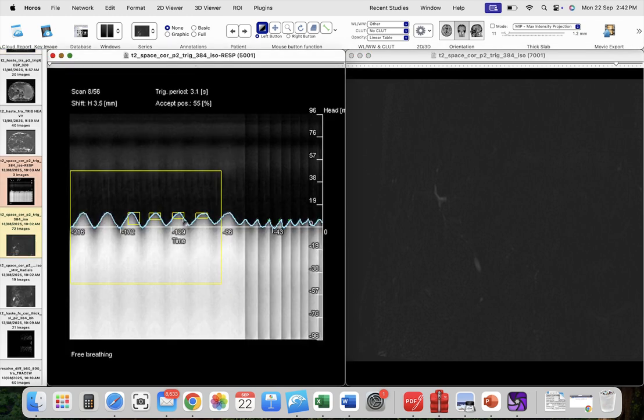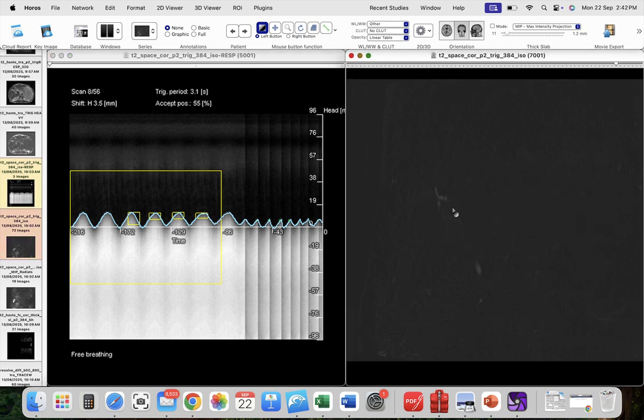This is an example of the respiratory navigation. Like a localizer that is placed on the diaphragm, and it monitors the diaphragmatic mobility, and at certain points it starts imaging at certain periods of the respiratory cycle, to get this image without respiratory motion.